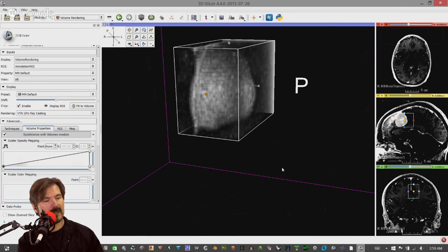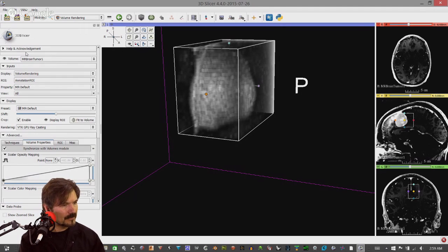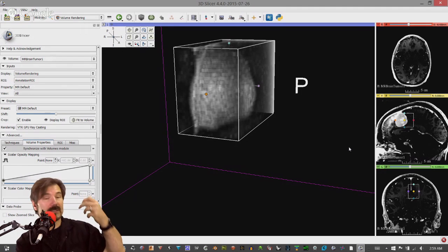Anything? It's pretty straightforward once you know where to go. But essentially, I'll summarize. You select whatever volume you're working with, and you can create several. In fact, you can create several volumes with the same set of DICOM views. So that is one of the strengths. So you select the one that you're using. As I mentioned, we only have one here. Then you select your inputs and your region of interest, and you can have several regions of interest. Here we're just using one set, but you could actually use more than one and select those differently. Then you select the type of display.